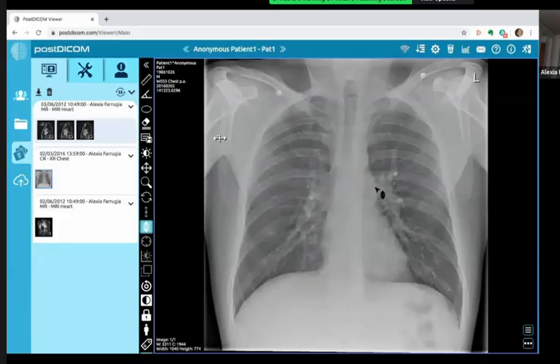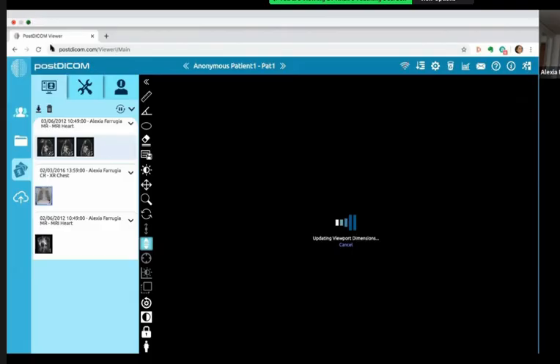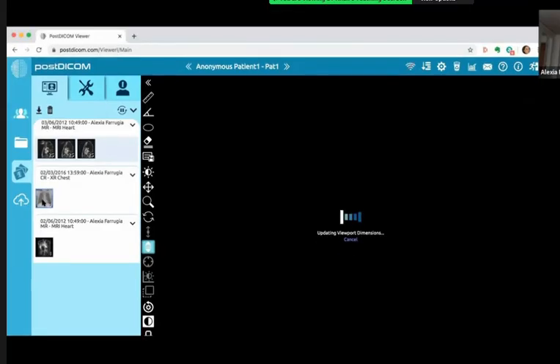Unfortunately, I don't have a pre-op chest X-ray to look for rib notching and the manifestations of coarctation pre-op, but that was great. Well done. I'm aware that you don't see too many CMRs, so that was really good.